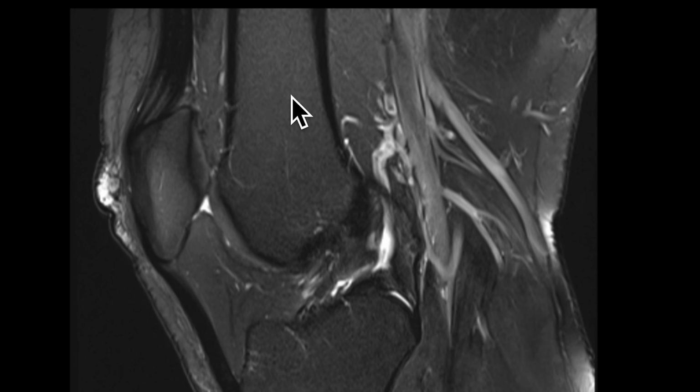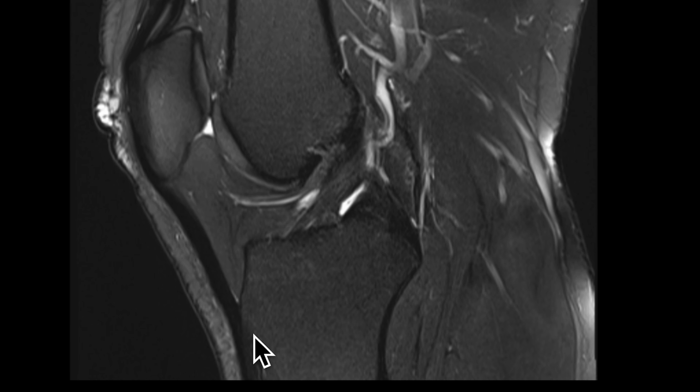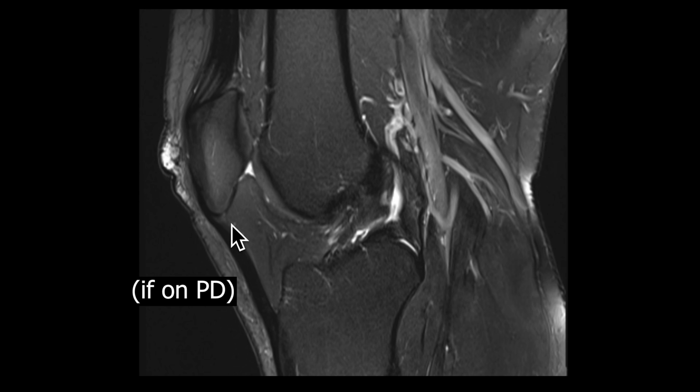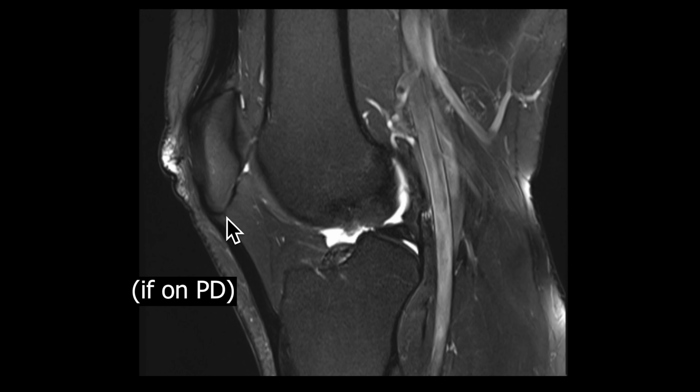Although if you can appreciate here, because the knee is in an extended position, the tendon itself is going to be lax. And then here's the patella tendon, which you can see is taut, extending from the inferior pole of the patella to the tibial tuberosity. Just a reminder that this bright signal we see here could reflect magic angle artifacts, and we tend not to call this a tear. We'll consider this a normal finding.